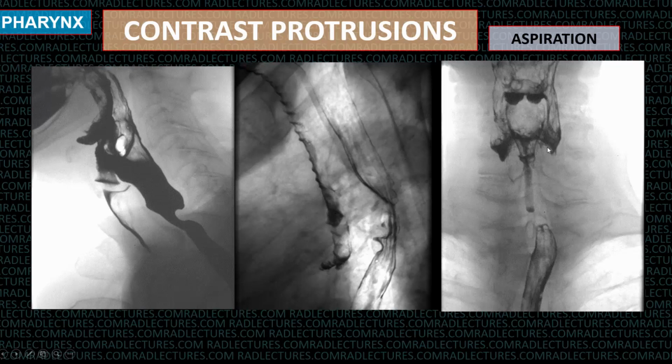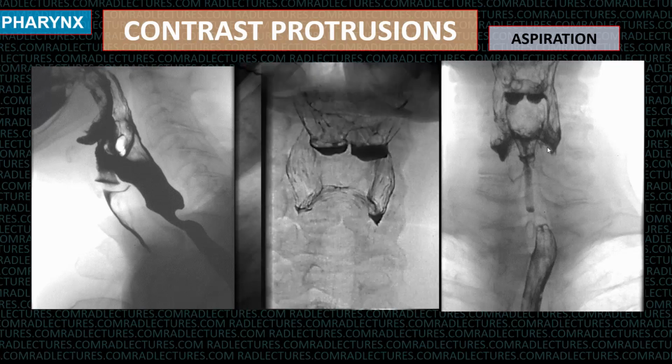See, what happens is, if I may show you a normal piriform sinus, here is the piriform sinus. This is the inferior pharyngeal constrictor. You can see the muscle fibers over here. That closes it. But when there is contrast going anterior to it, that is going to be going down in the midline. Whereas in the normal pharynx, you do not see any contrast in the midline.